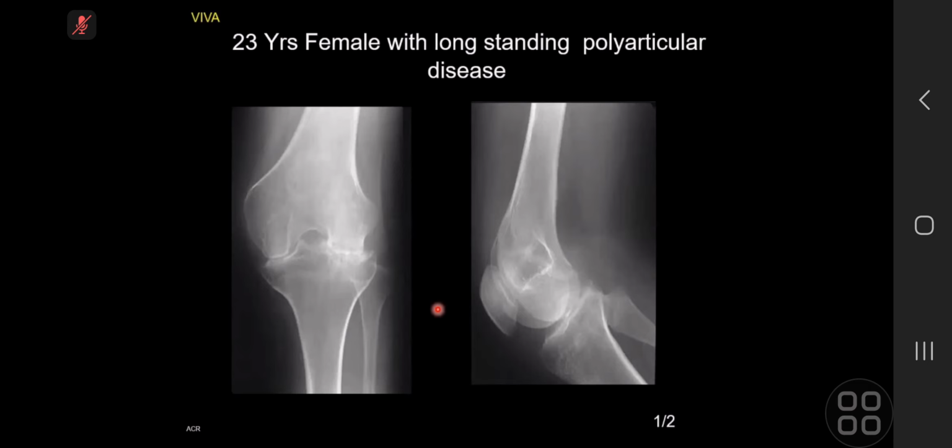There is widening of the intercondylar notch on the frontal radiograph with moderate to severe degenerative changes, particularly in the lateral tibiofemoral joint. In addition, on the lateral radiograph, there's probably some degenerative changes around the patellofemoral joint also. On the first image, there looks like there's some erosions around the lateral femoral condyle, which is also smaller than the medial side.